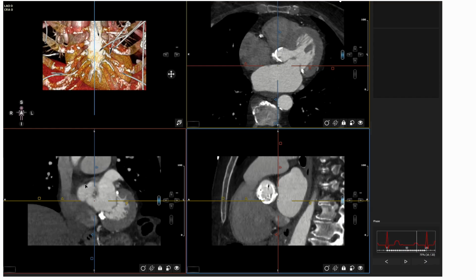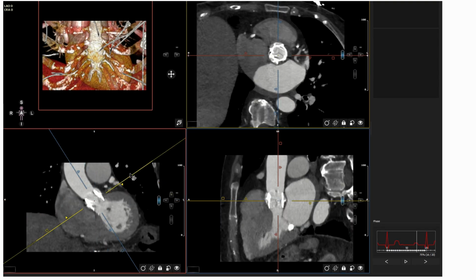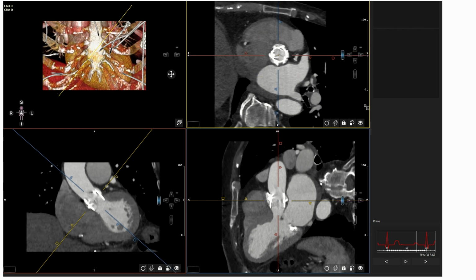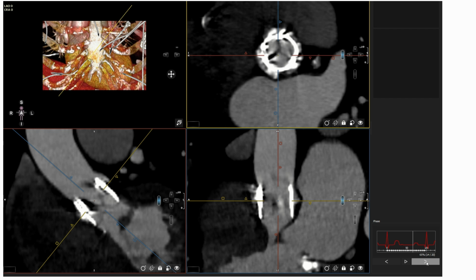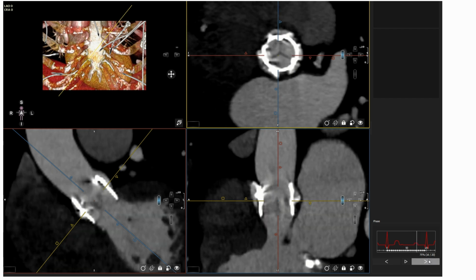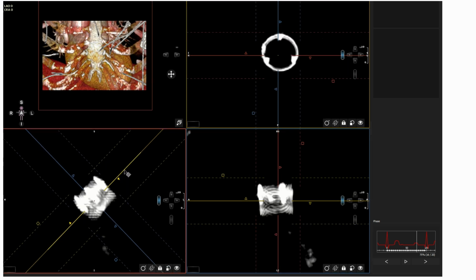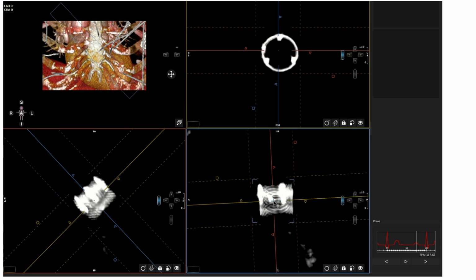Open your patient CT dataset on a CT software. We can use any CT software. We just need a 3D MPR, multiplanar reconstruction module. After determining the appropriate cardiac phase, adjust the MPR to be orthogonal to the valve, while fine-tuning the image thickness and window level as needed.